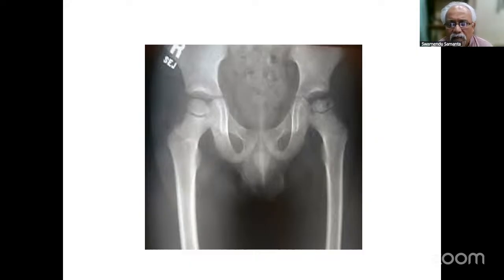If you compare the other side, now you will understand, as John sir is telling, you see the other side, the volume of the epiphyseal part. You can see now. Then if you see the epiphyseal line, whether it is horizontal or how it is oriented, and you see there is a fragment, there is also fragmentation, and this is not matching with this part.